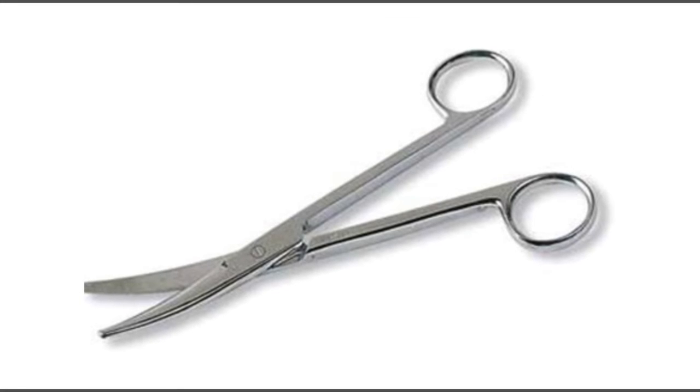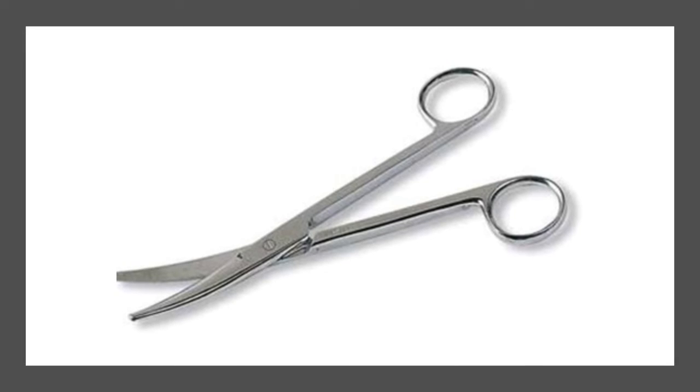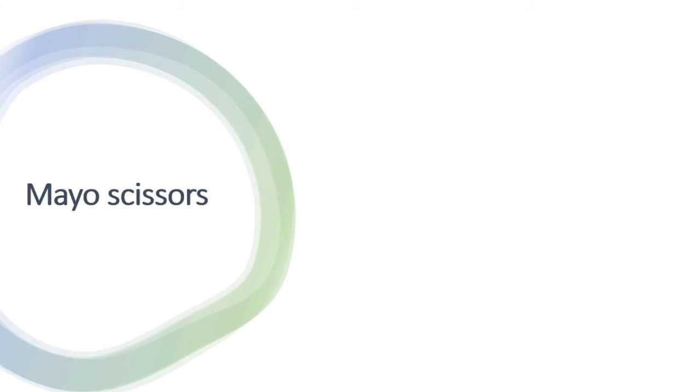Right, this is also a type of scissors, as you can see, but what are they called? So these are Mayo scissors.